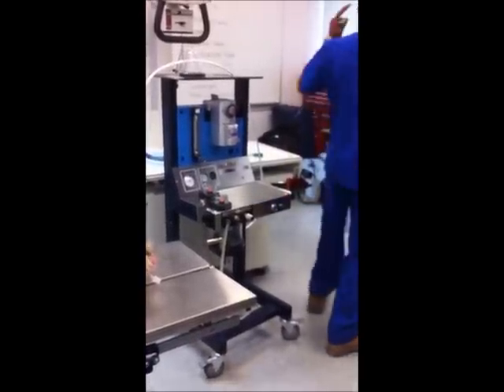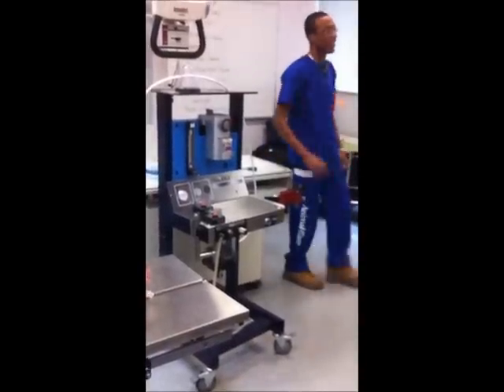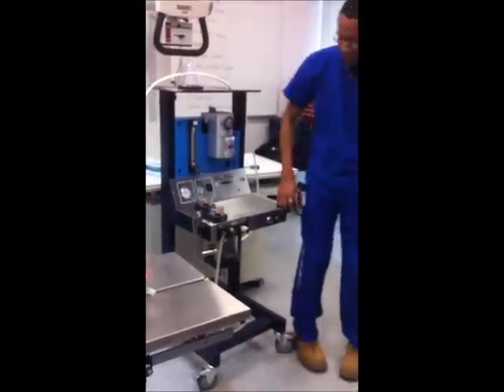Yeah. You know what I like? I like the fact that it's up on the board. They say most of it, and they still say thingy at the end. Canister. The soda lime canister.